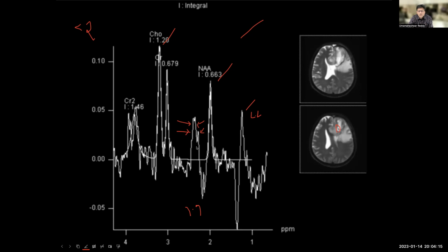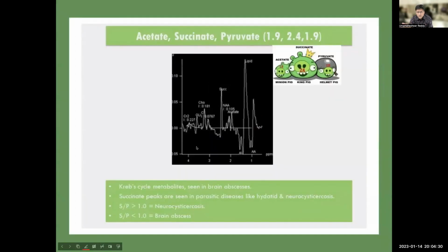So this is an interesting case solved with MR spectroscopy. So it can be very useful in some cases if you can find how to interpret it properly, and if you know how to check for the individual metabolite peaks, it will definitely help.